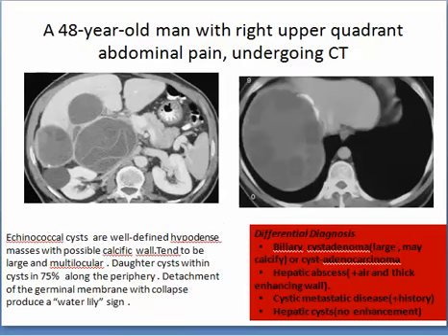Now here we have something different. We have the large cyst with many peripherally arranged smaller cysts and showing calcification, or one of the germinal layer is separate, denoting water lily appearance, and here is daughter cyst at the periphery.